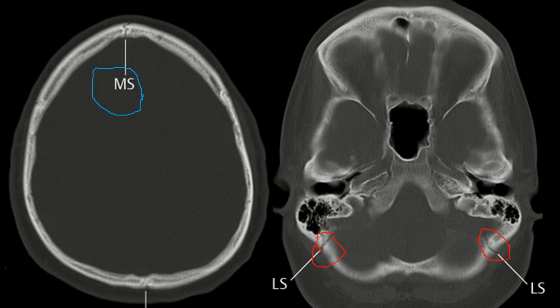If you remember from anatomy, when present, a metopic suture separates the two frontal bones. So if you look at the metopic suture right here, you can see that the cortex dips into the suture on either side. Let me clear that. What is most striking is that the suture is jagged. It's not a straight line.